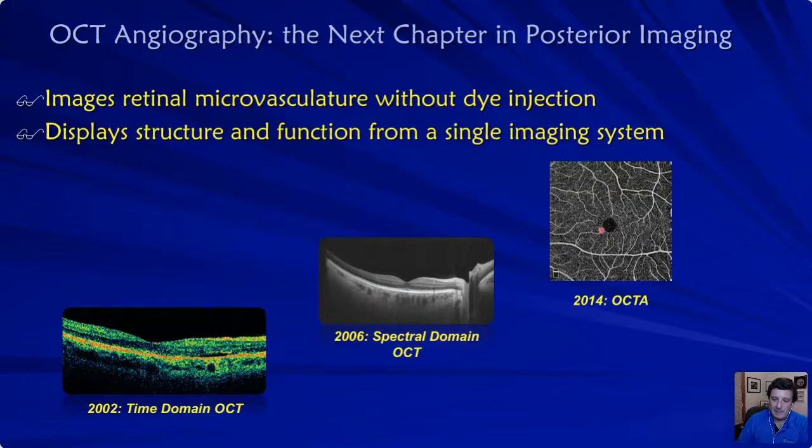Again, a lot of people are saying, well, which one is it? Should I do angiography or should I do B-scan? I call these B-scan angiographies, and this is just your OCT angiography. A lot of people ask which one it is. It's like a 78 or 90. Well, you kind of need both, right?